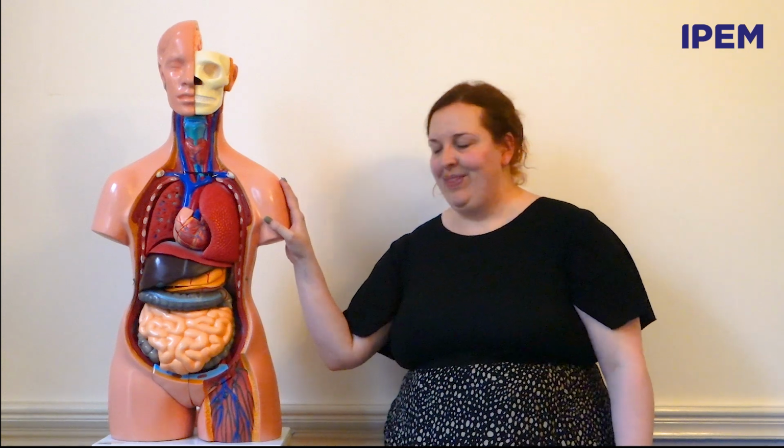Hi everyone, I'm Jen, and today I'm going to be talking you through a demo of our torso that we have here. And this is one piece of equipment that we have in our IPEM Outreach Library.